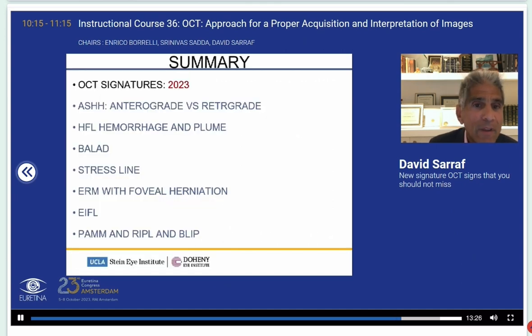And that's it. Here's just a summary of all the lesions we've described, and I hope that you'll identify these when you're in clinic, as they will be diagnostically helpful and even helpful with management. Thank you very much for your attention.